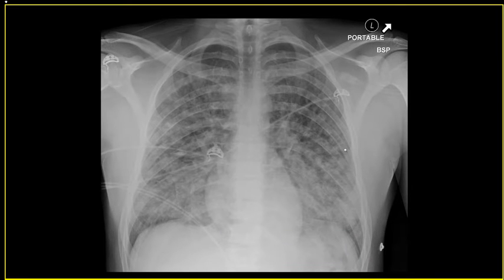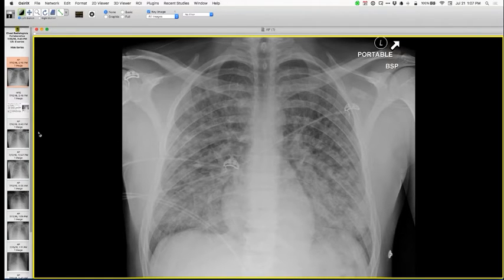If the context is an acute febrile illness, which it turns out to be in part, then one should be concerned about a pneumonia, but something other than an everyday community-acquired bacterial pneumonia. And with septal lines, one thing that I think of is hantavirus. That's described as having an appearance that may be like lung edema with septal lines.